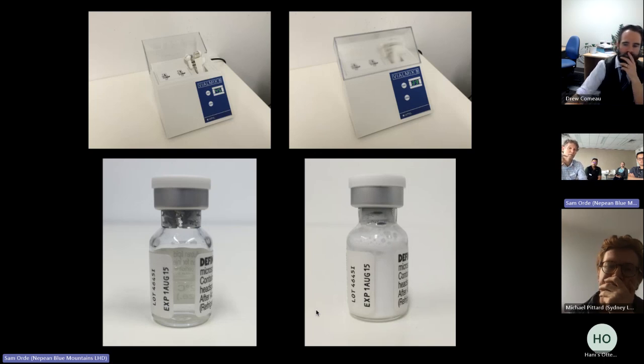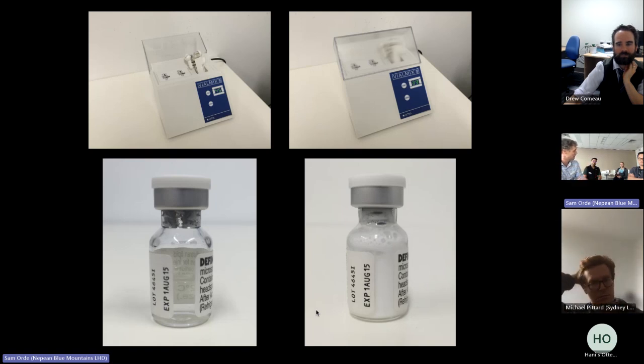And then you can either put that through a syringe pump and just roll it through at about 10 to 15 mils an hour, or you can run it through a little bit faster if you want, or, as what I mainly do, I just bolus it 1 or 2 mils at a time. Sorry, Sam. So you'll dilute that out, say in 10 mil syringes? 20 mil syringes. So you draw that 2 mils of activated Definity into a 20 mil syringe. Yeah. And then you just give a little squirt at a time.